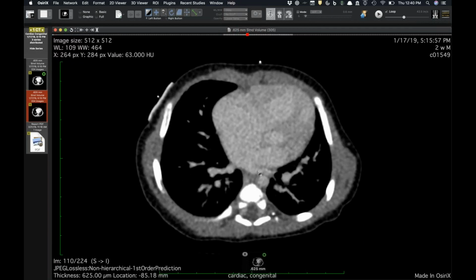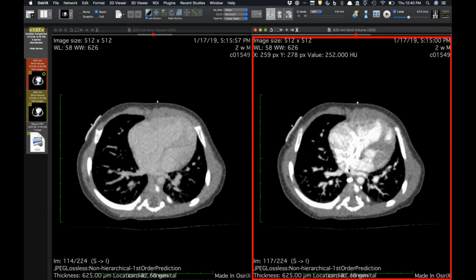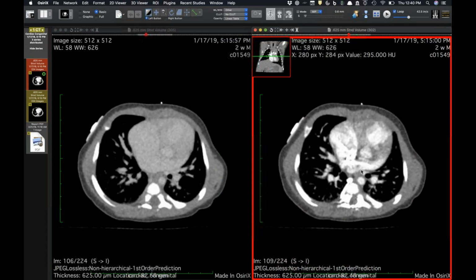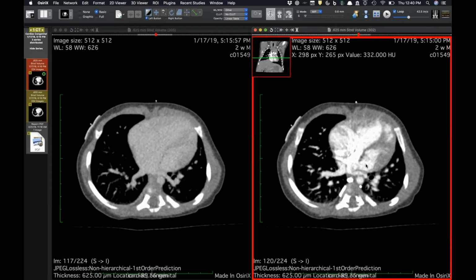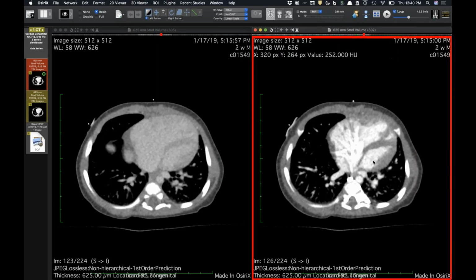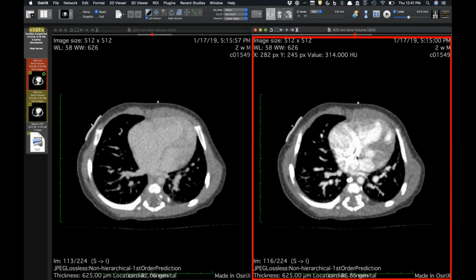But the right atrium has just overtaken all of that, and then the pulmonary veins cross midline to insert here on the right side of this interatrial septum, on the back of the atrium. Yeah. Wow. Yeah, so there is an interatrial septum, and there is a left atrium, because you can see it here, and there's a formed mitral valve. It's just, for whatever reason, the atrial septum just decided to take over most of the left atrium.